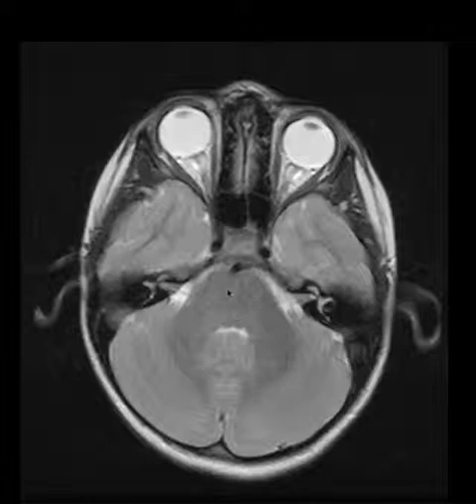This here is at the very bottom of the pons. CSF fluid. So this is the fourth ventricle. You can still see the outline of the cerebellum. I'm going to move to the next slide.